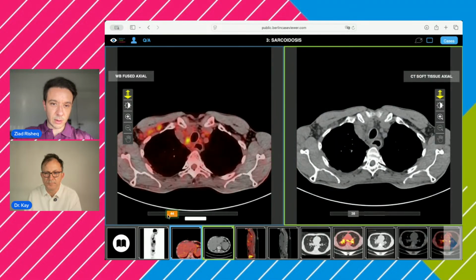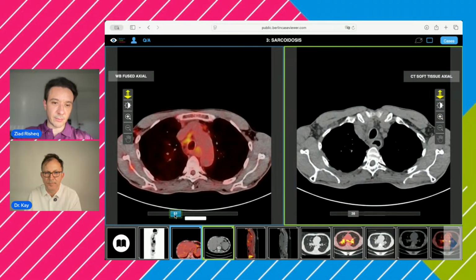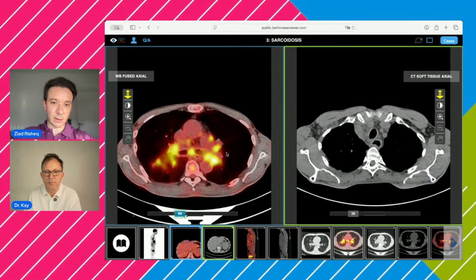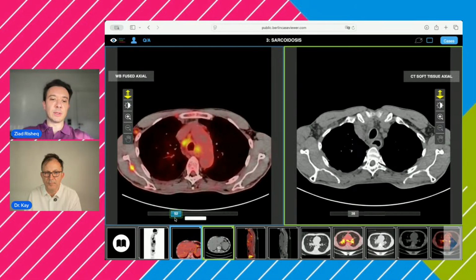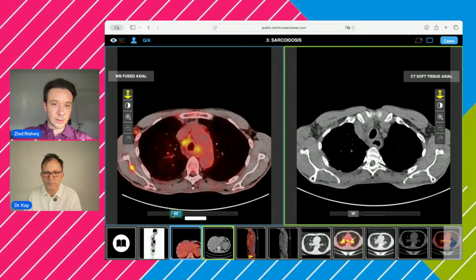I think we saw one up here, and below the aortic arch, these are lower paratracheal lymph nodes, level 4, bilaterally. We have subcarinal and hilar lymph nodes, and the subaortic AP window nodes. So basically, we have multi-regional mediastinal lymph nodes and bilateral hilar lymph nodes. We can also see here a small internal mammary lymph node.